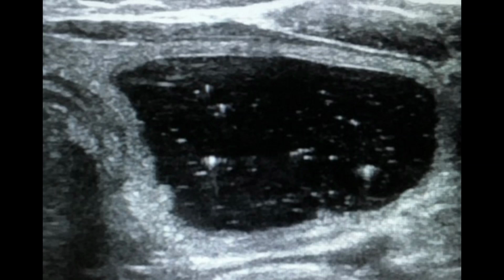a U2 benign lesion, and this would be classified as a colloidal nodule or colloid. It is a characteristic of colloidal nodule that it usually appears as a cystic lesion. And the second thing is, if you closely look for the internal low level echoes or internal contents, small echogenic foci with a small tail would cause an artifact, and this would be considered as a ring down artifact. This is the characteristic of the colloidal nodule. So this is the second feature of the U2 benign lesion.